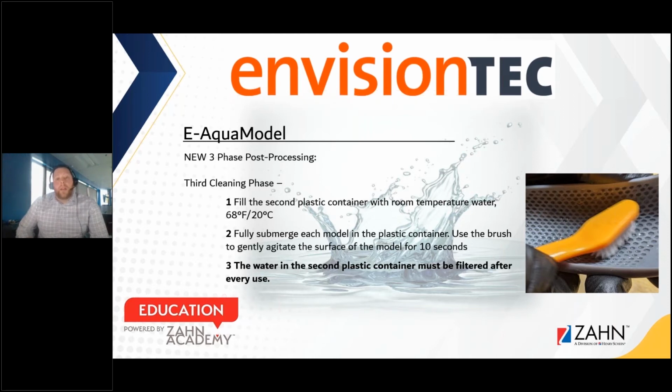And then after that, we bring it back into the second bath, which is where we go ahead and agitate the models a little bit with a brush to remove any excess resin that's maintained on the model at that point, to ensure that we finally remove all aspects of that. So this is huge because the way that this is handled is a lot faster and a lot cleaner than the previous cycles that we had to do with resin printers.